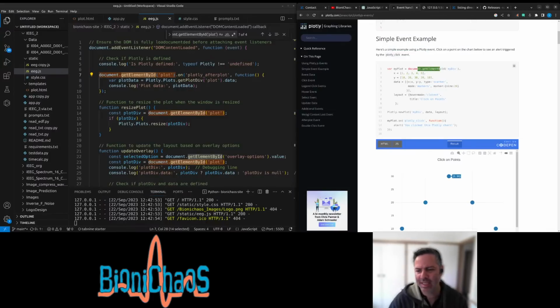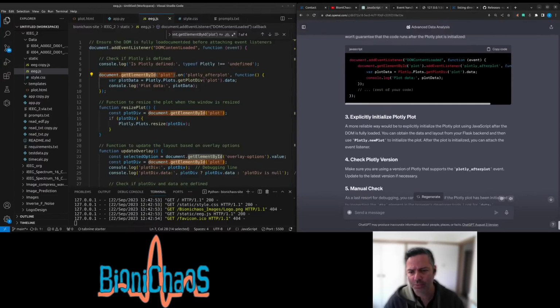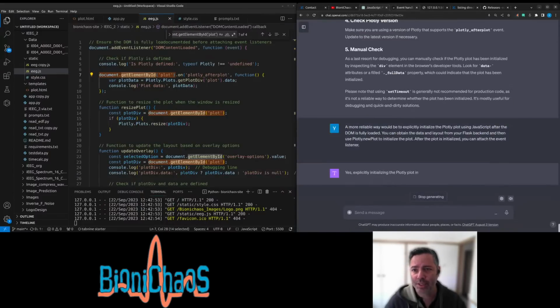Yeah, we're not clicking on the chart though, we're clicking on HTML items. So we probably should, yeah, probably should go for this one. Just regenerating the chart.